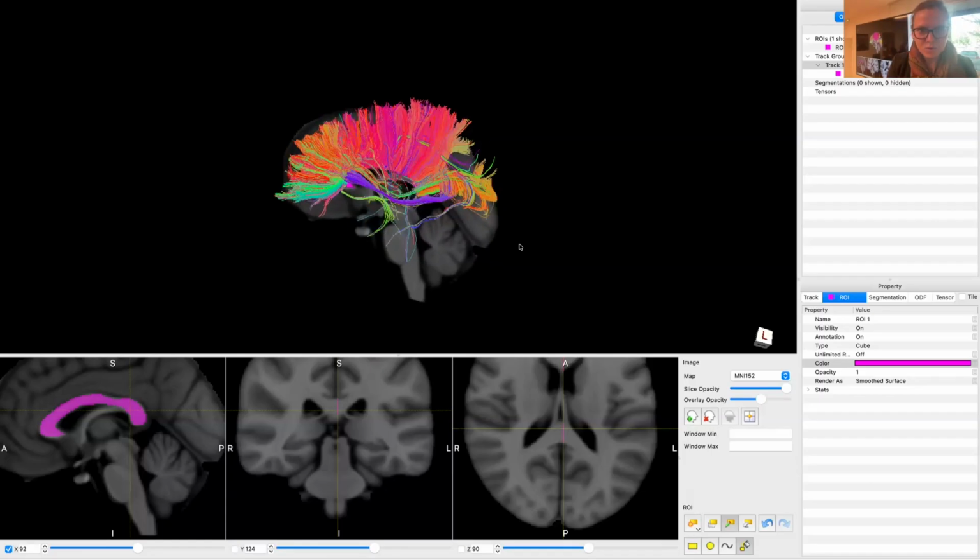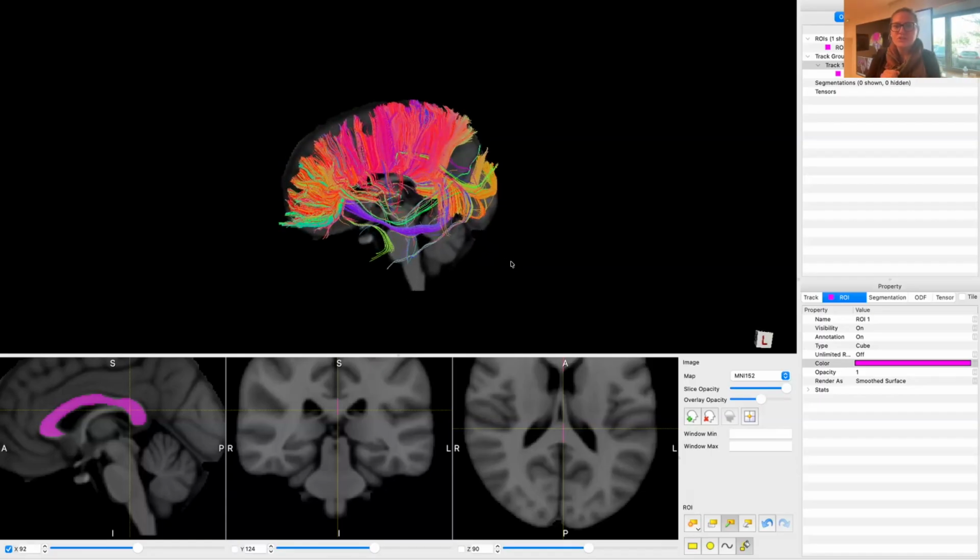Now, you've had a lot of methods talks this morning. What do you think? Do we only have the corpus callosum? Do we have artifacts? Do we have other tracts? We have a lot of other tracts, says the neurosurgeon at the back.